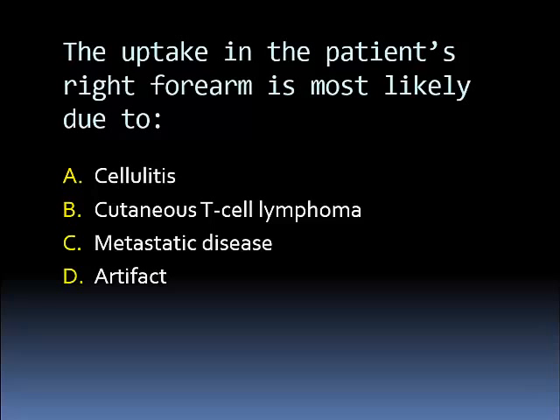So most people picked cellulitis, which would be a possibility, although cellulitis should be more superficial. We come back to this presentation. The answer is that this is actually an artifact, but not an artifact of imaging. It's an artifact related to the injection.